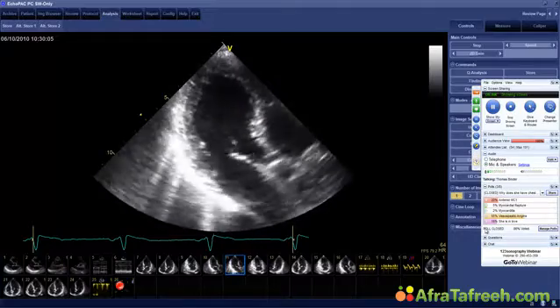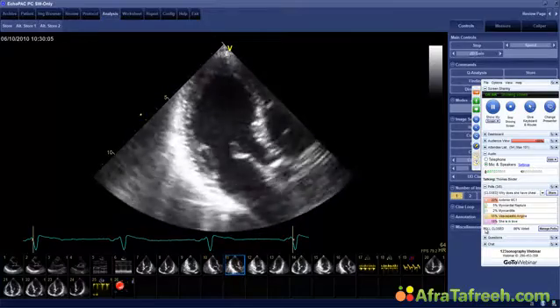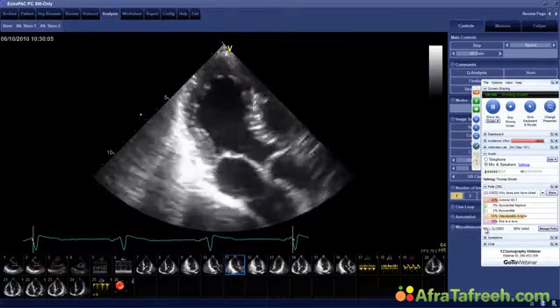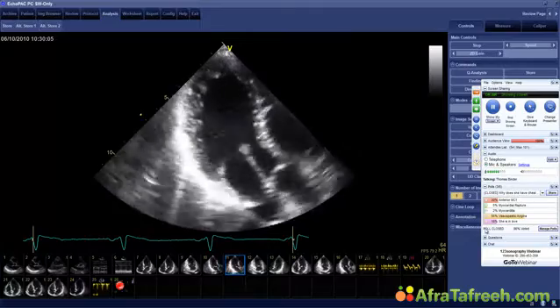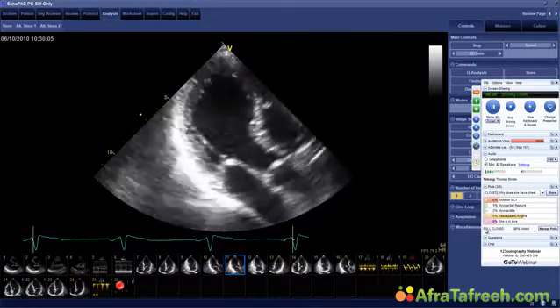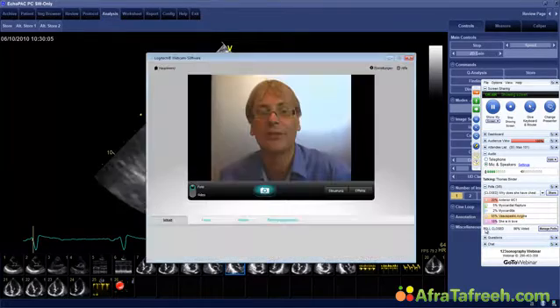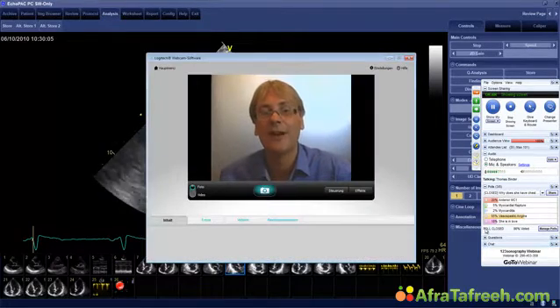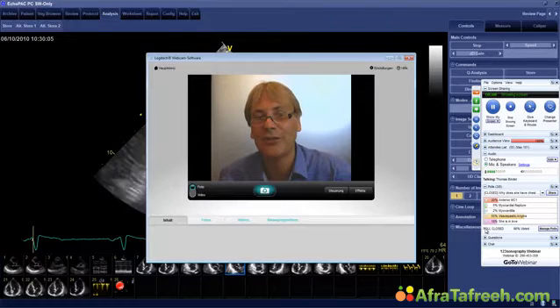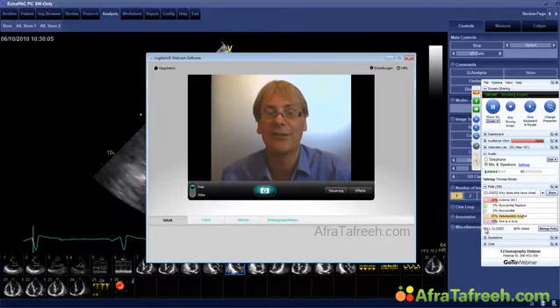So don't be fooled. The regional wall motion abnormalities can obviously be something else as well, but still, I'm showing this case, but in reality, be aware that this is a more rare or not so common disorder. So if you see wall motion abnormalities, obviously first think of an LAD occlusion and an anterior myocardial infarction. So this, I think, was a very nice case, which shows you how much emotionality can actually affect the heart, and that there is a close link between other things aside from the bread and butter coronary artery disease and atherosclerosis.